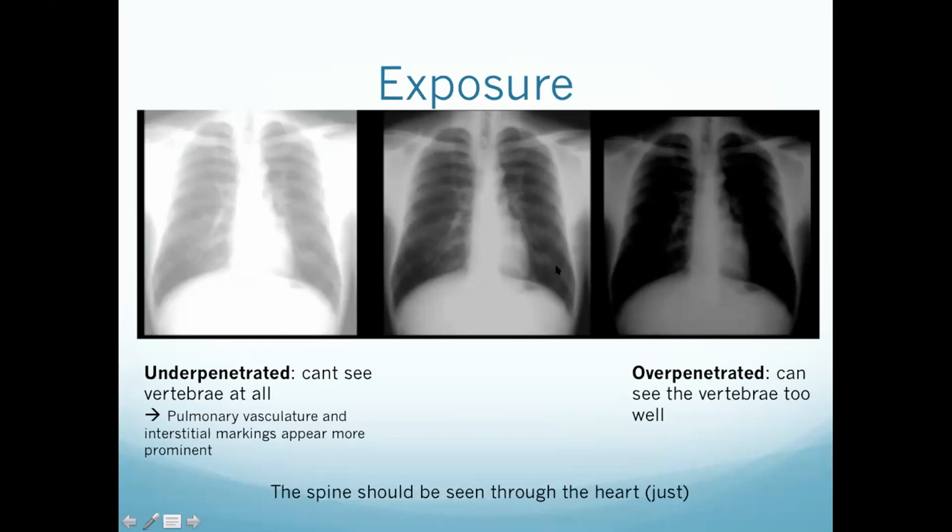And then on the right picture, you can see it's over penetrated. That means you can see the spine too much. And if you look at the lung fields, it's very dark and not very easy to read.